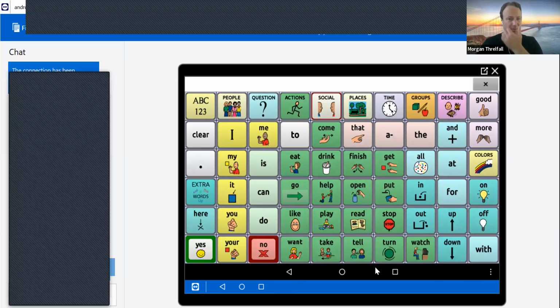Now, some kids we work with are used to these home buttons and menu buttons from using their iPad, and they may use these buttons to get out of the communication software or to make changes on the device. And so in some cases, it might be a good idea to lock or hide some of these menu buttons if your student is using them in a way that isn't helpful. So we can lock all of these buttons. On the right, on the menu, we can lock these three dots here and put it so that we need a password to get into the menu and change settings.